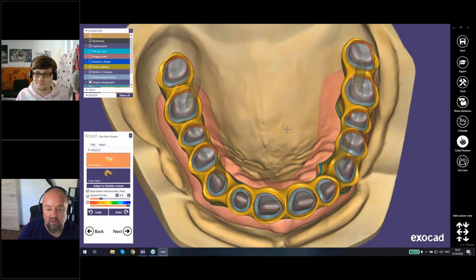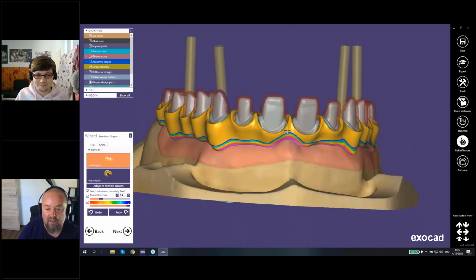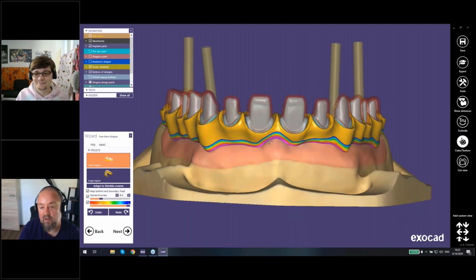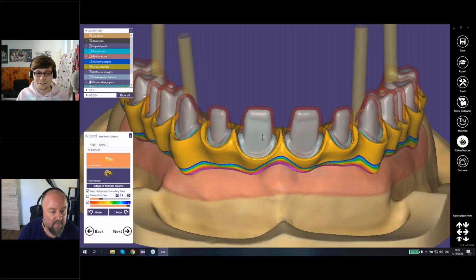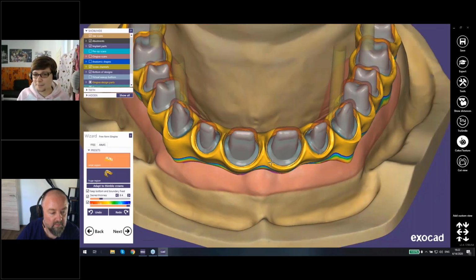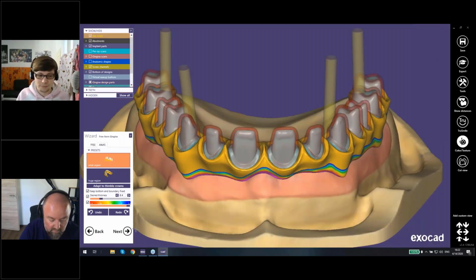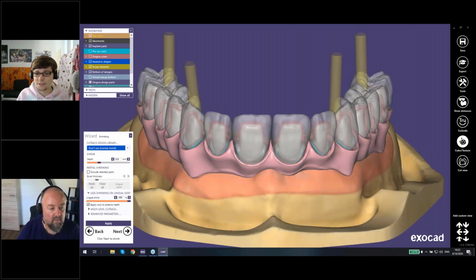So the doctor would have to close it manually with some resin or whatever, and therefore it's better to have it in the die of the thimble, so that it will be closed automatically when you put the crown. Or you completely try to exit in the gingiva area, and then you can easily also close it with another material later. Yeah, that's absolutely correct. So for the software, it's not a problem. Obviously, for the manual side of things, it might be a problem, or it actually will be a problem. But the software doesn't have a problem with it.